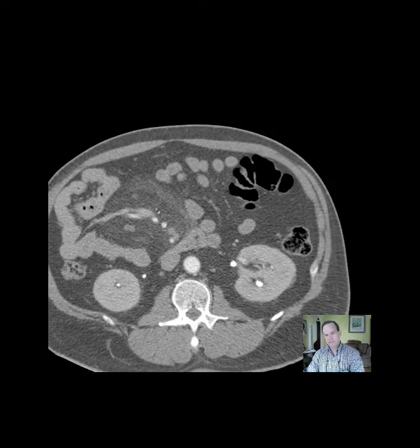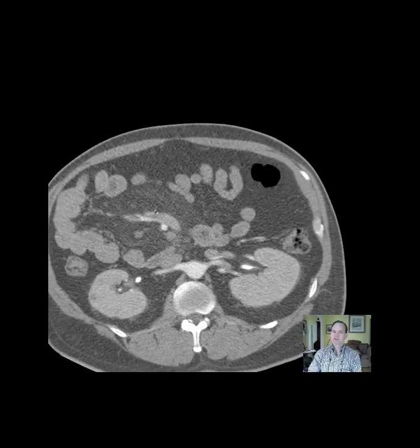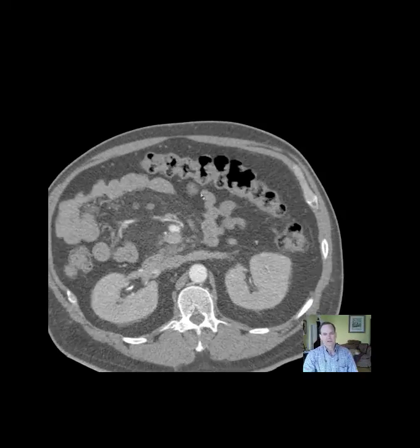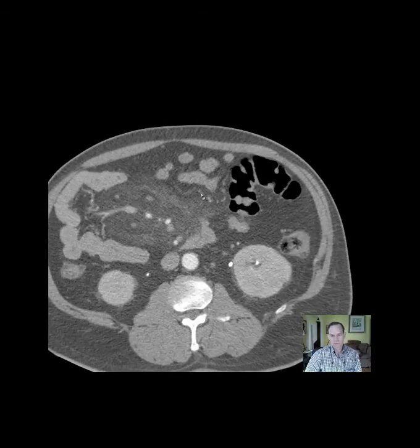But I find it a little vague and unclear, but it's important to recognize that if there's haziness in the mesentery, that the term sclerosing mesenteritis comes to your mind, and that you are aware that it may be of very little significance. There are a number of possible causes and associations, including cancers, carcinoid, lymphoma, and that's adequate to appreciate at this point.